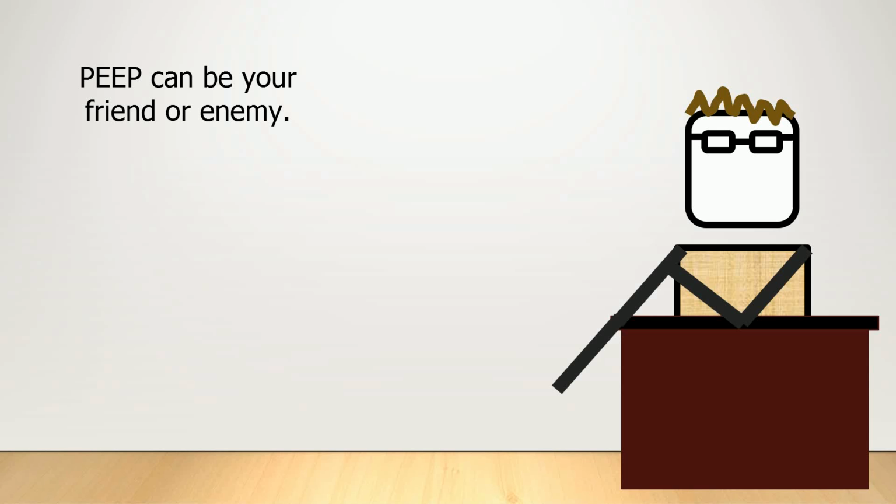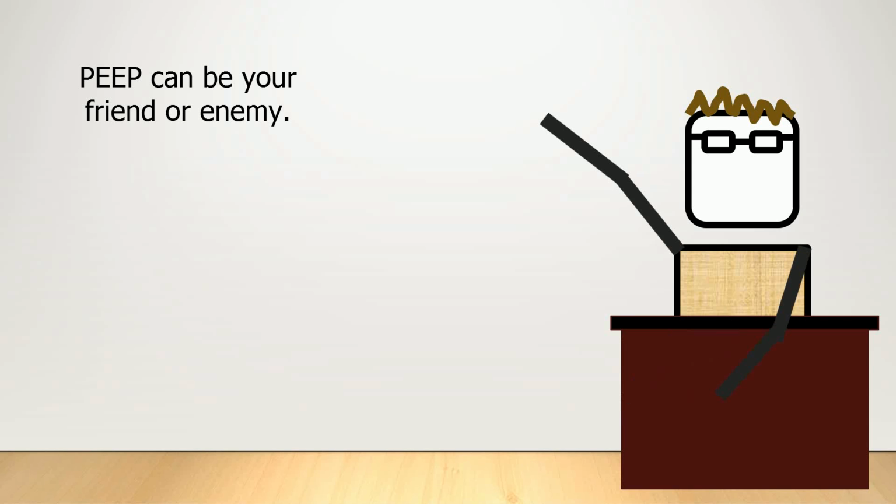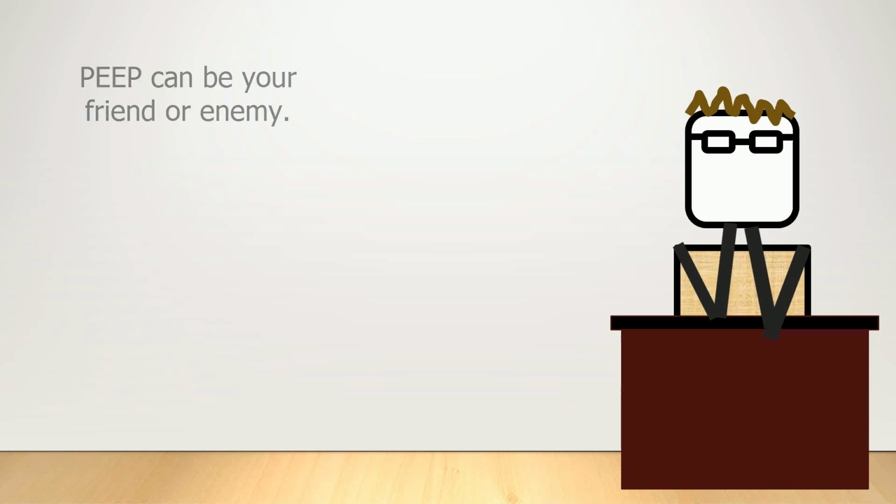But if you closely match the PEEP and don't exceed the intrinsic PEEP, then the patient can easily trigger the ventilator and not increase their workload. As well, trying to match the PEEP provides some benefit in improving VQ mismatch and oxygenation, but in reality this is more of a secondary goal.